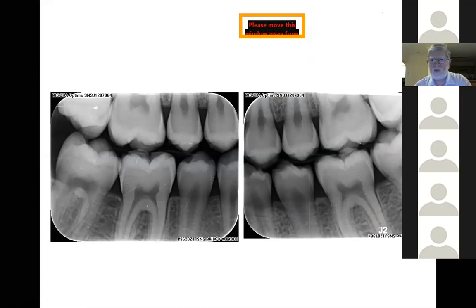And something interesting here now on the 3, 7 and the 4, 7. Can anyone tell me what they're seeing here? So the answers we're getting are enamel pearl and paramolaris.